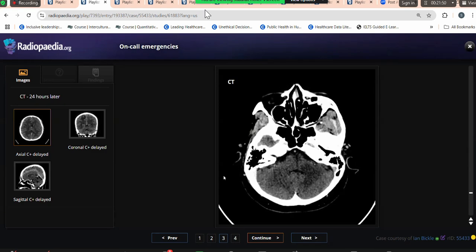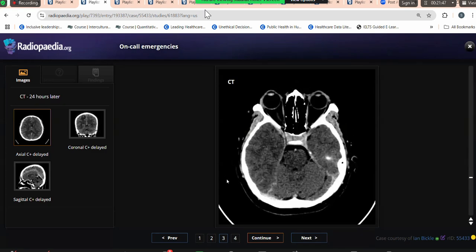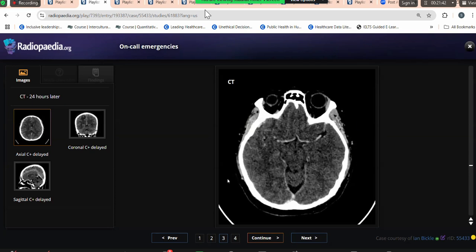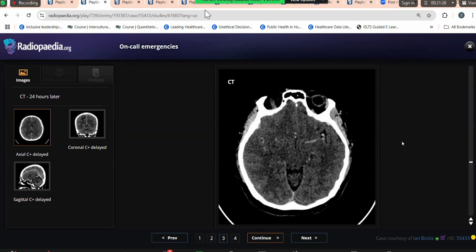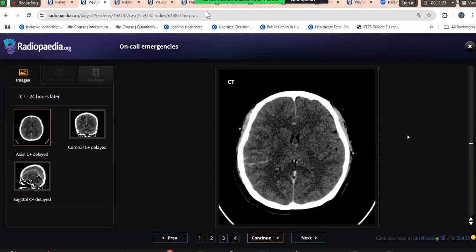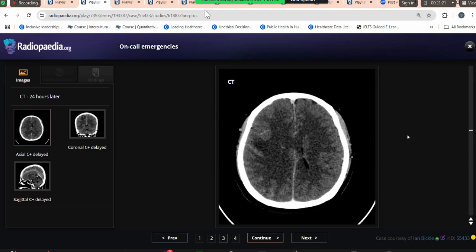So this has likely progressed to cerebritis, and I would... Are you scrolling? So ma'am, I would just alert the referring physician of these findings. So you saw the right-sided changes and you are thinking, keep scrolling.